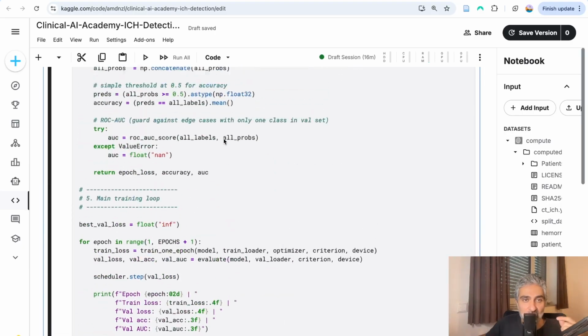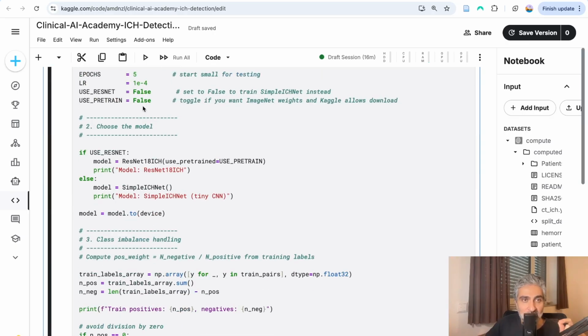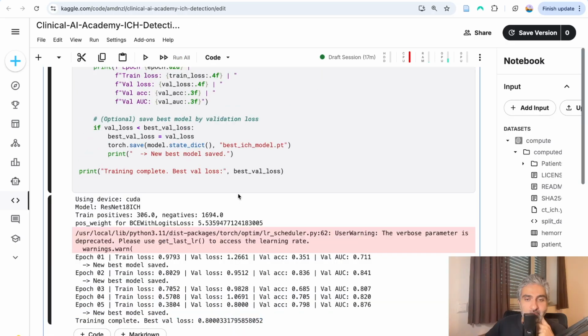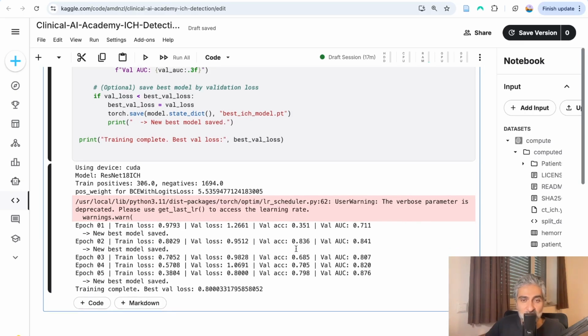And then let's retrain, but using ResNet, now without the weights from ImageNet, so just ResNet as an architecture. All right, you can see now it's a different situation. The validation loss is also decreasing, but this time decreasing more than the previous one. The accuracy started low again, but it increased, then decreased. So still, but I guess the variation is not as sharp as the previous one, so we have a more solid, consistent performance.